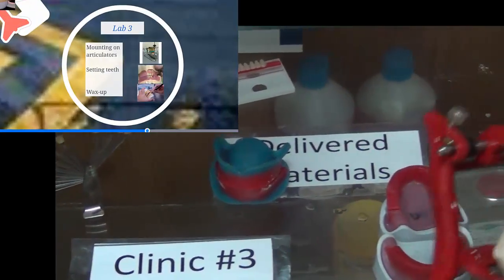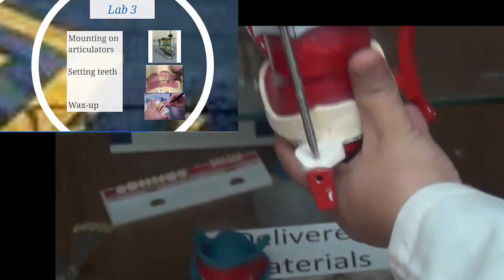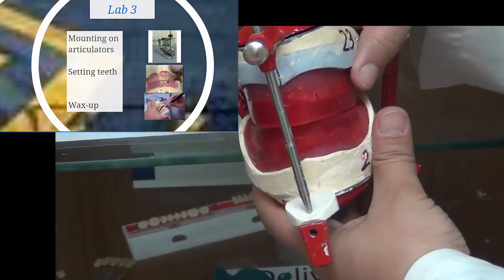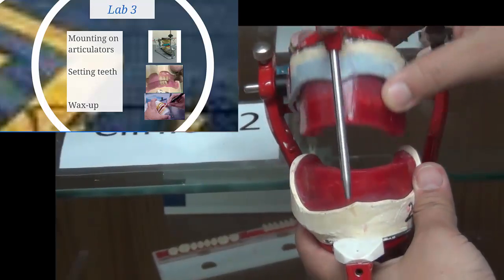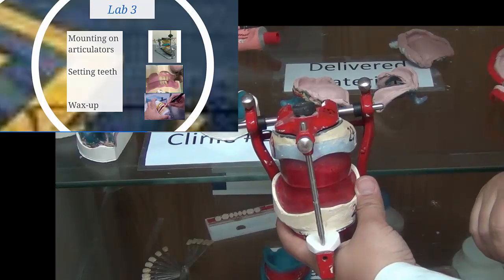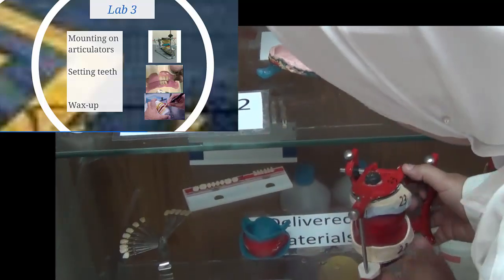The technician will mount these upper and lower wax rims on the articulator, using the record from inside the patient's mouth. So once these are on the articulator, once we open and close, this is the same way that the patient opens and closes. This step is called mounting. So the casts are mounted on the articulator, and now we're ready to put in teeth.